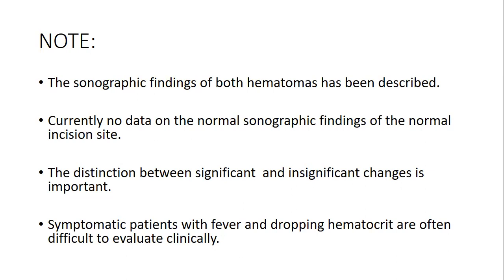But what is key is that the distinction between significant and insignificant changes is very important to realize at the site of incision. Sonography plays a role to help us realize whether the site of incision, be it on the anterior uterine wall or within the anterior abdominal wall, is okay. Remember, they use sutures to close the incision site.